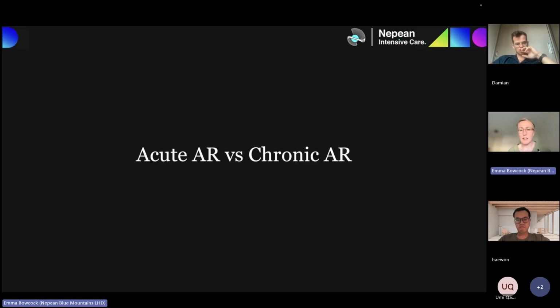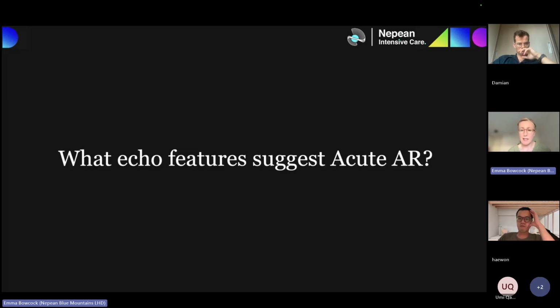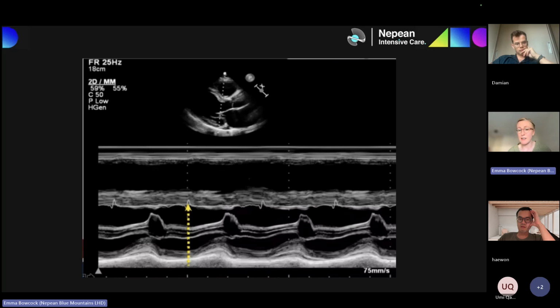So just quickly again, because this is one of the take homes, is differentiating acute from chronic. Know the difference there, because this comes up in exams all the time. So I'm just going to quiz you. This is a point and shoot. If you know it, say it. If you don't, then I can just tell you what it is. What are we looking at here? This is classic for American exams. They'll show you just a picture like this and ask what it shows.